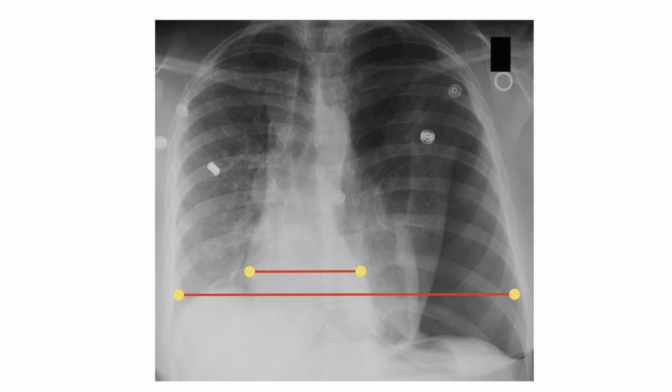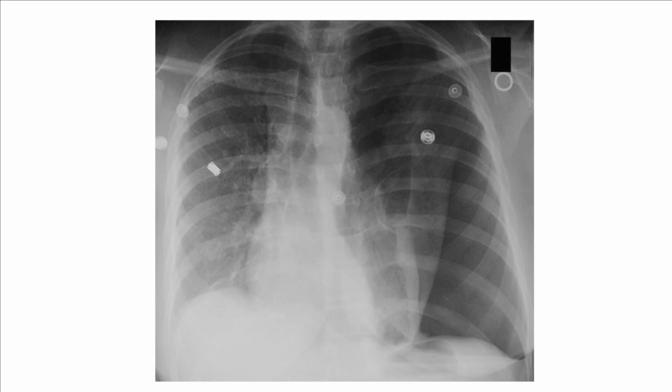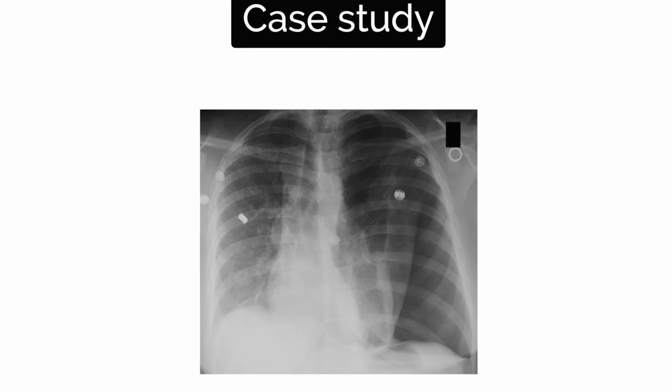The cardiac size is normal, although shifted to the right. The left heart border is less defined, which likely reflects compression from the adjacent lung parenchyma. The right hemidiaphragm is normal. The left hemidiaphragm is also normal, although there is slight distortion of the pleural spaces. Looking at the bones and soft tissues, there are no gross abnormalities visible. Metallic stickers appear to be visible, which are likely used for the attachment of ECG leads.